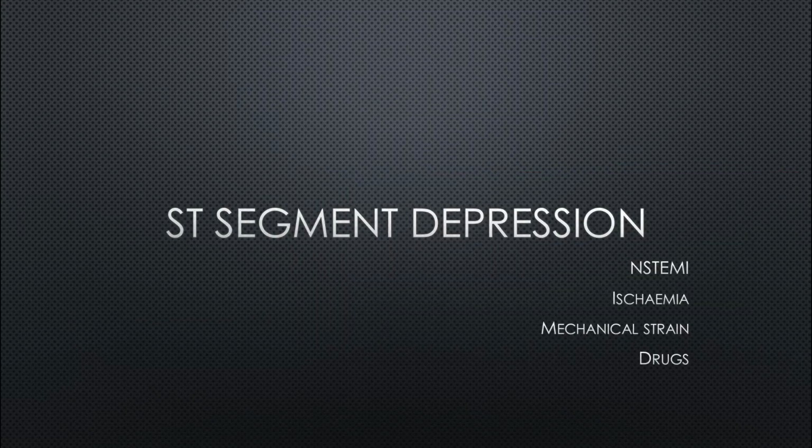Right, this brings us to the next topic we're going to look at, which is ST segment depression. So these are associated with a non-STEMI, with ischemia. It can be caused by mechanical strain, and although not as common as it used to be, could be caused by some drugs. Again, it's going to require some clinical differentiation to pinpoint the most probable cause. The ECG characteristics are going to differ slightly between the causes as well.